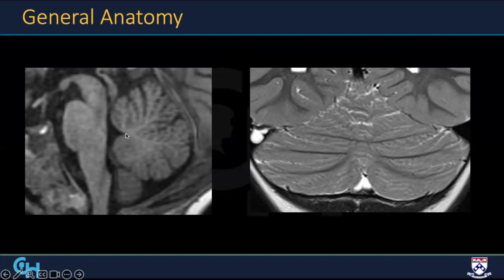The fastigial recess of the fourth ventricle here is sharp, shaped by the nodulus located just below the midpoint of the pons. If you draw a line from the fastigial point here through the primary fissure, this breaks the vermis down into a roughly 2 to 1 ratio below versus above that line, and a mature vermis extends from approximately the mid-tectal plate to the level of the obex.